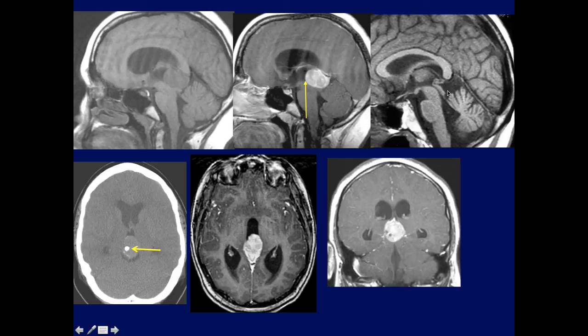Notice this is the normal. So here's the pineal. Here's a quadrigeminal plate, and we see the suprapineal recess and the aqueduct here. This is all kind of pushed forward, and this is rounded appearance by an extraventricular mass. An intraventricular mass will never do that. Anytime you see this curvature, that has to do with an extraventricular mass. In this case, again, a larger calcified meningioma.